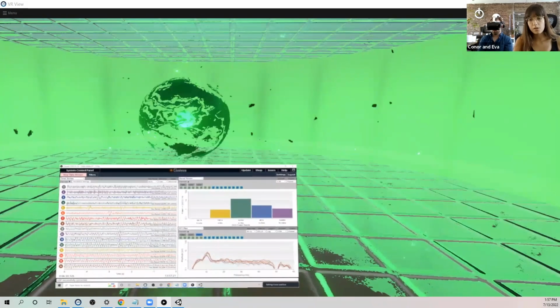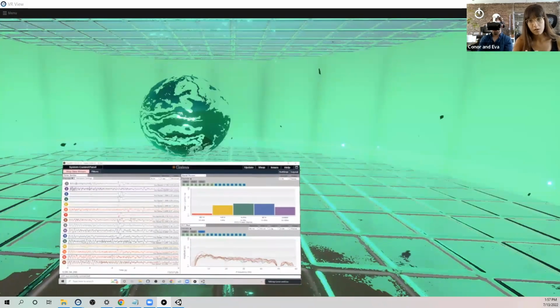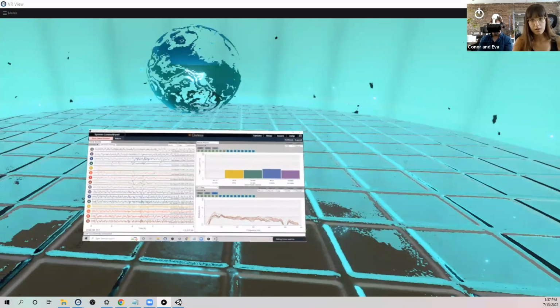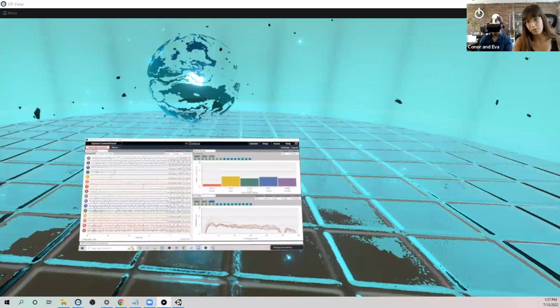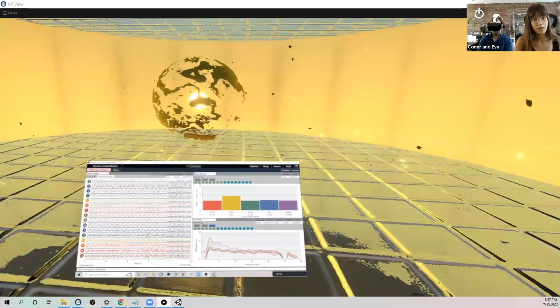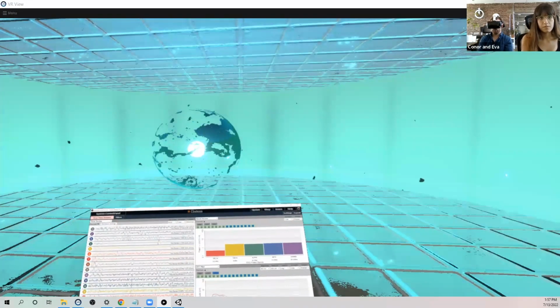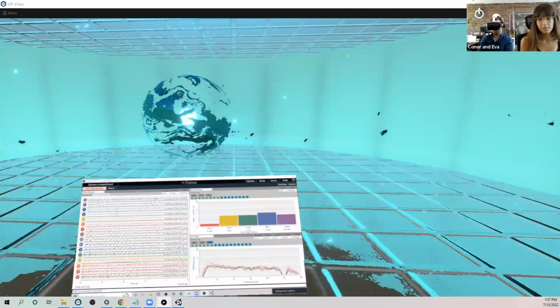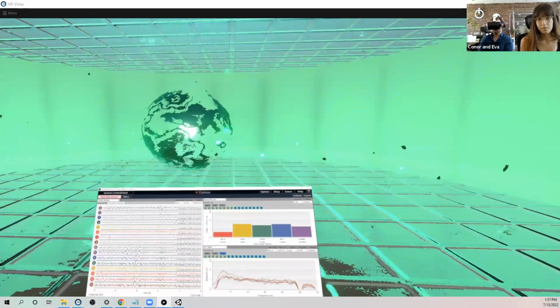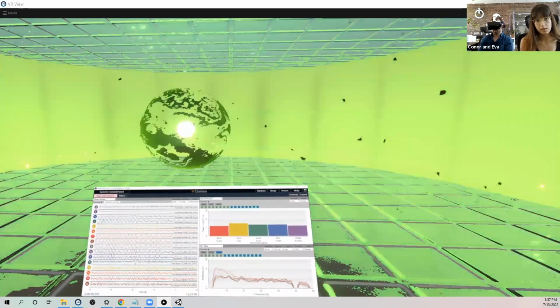So the purpose of this room is to provide a playground based on neurofeedback so that you can train your brain to be able to produce the different frequencies. Now I'm simulating a theta, which you can do if you get into a nice deep state of meditation, but I'm going to fake it by blinking my eyes at about 5 hertz. Theta is 4 to 8 hertz, in case you guys can't see it in the GUI.